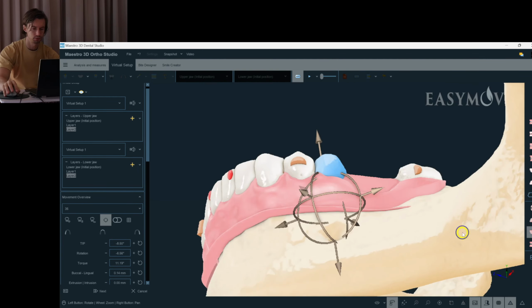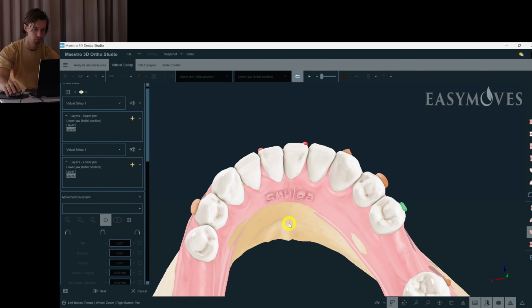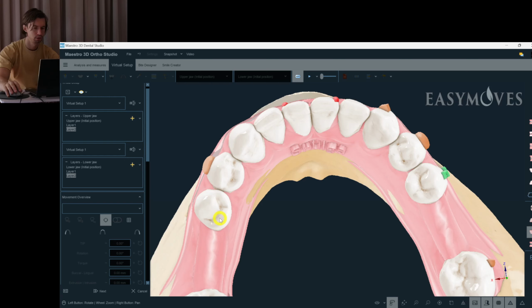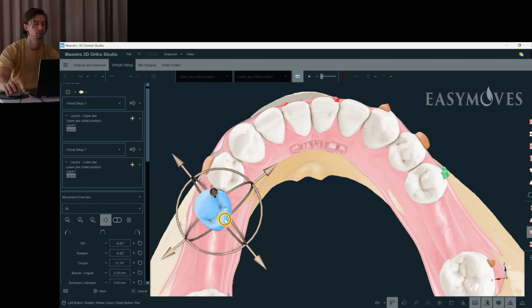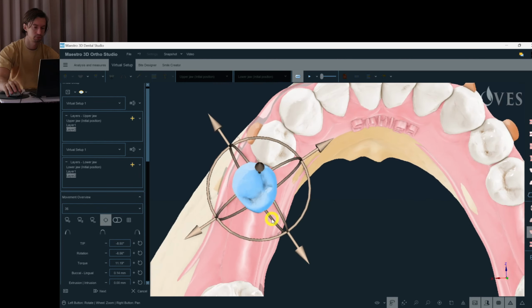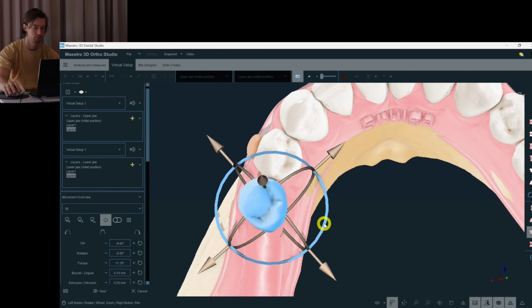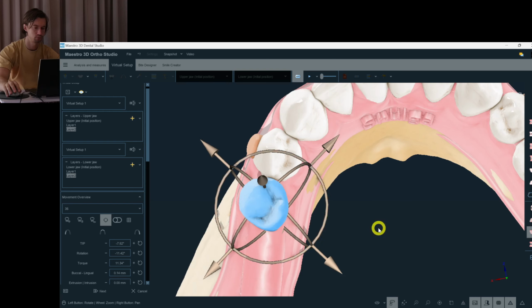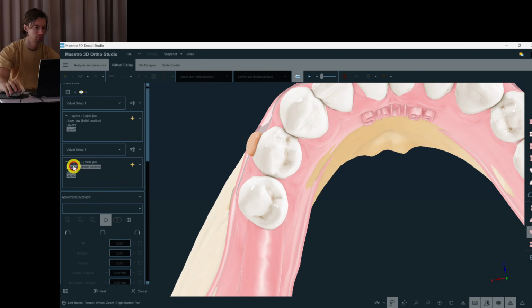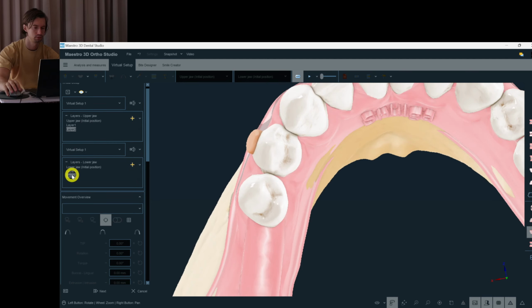I'm not going to make a complete rotation for the premolars, especially for this second premolar on the left side, because it doesn't have any sense in my opinion, and it's just difficult for aligners. We can add some more, but I think it's an immediate relapse here.